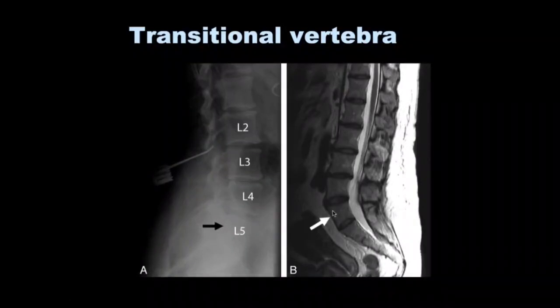The reason why this is important is that when you put that in the report, if you take this as the L5 vertebra, where the arrow is, anything above that would be the L4, the L3, L2, and L1, and then you will number the nerves accordingly.